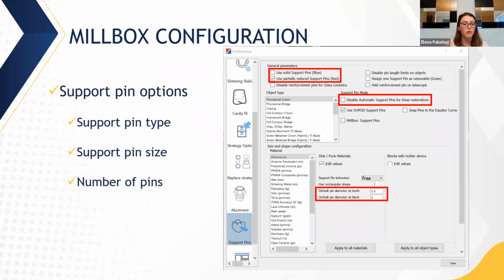There's a few customers I've noticed that have a lower diameter connecting to the crown to avoid that manual finishing, and higher on the offset wall. Any of those can be automatically set for you, so you don't have to constantly do it with every project or with every object.